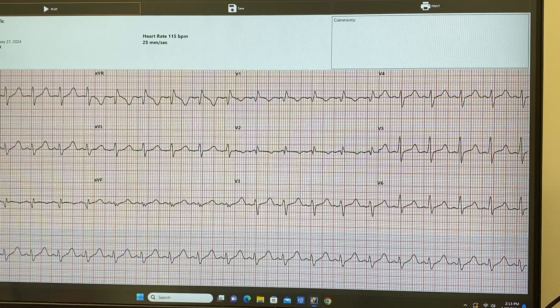Diffused or local. Okay, good. Now you need a 12 lead for that, right? What does diffused mean? Diffused means that it's consistently throughout the whole strip. So we know that, the whole 12 lead. Oh, the strip is just 3 lead. Okay, yeah. So then that tells us that it's hyperkalemia. Okay, can you point out which one it is?